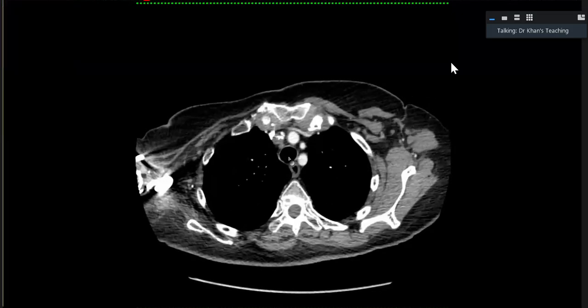So one may get odd questions about anatomy, things like that, which is the nerve supply. This is C3, C4, C5. C3, 4, 5 is phrenic nerve, and this is what we call ventral rami. It is not brachial plexus, remember that. So this is C3, C4, C5, ventral rami of C3, 4, 5.